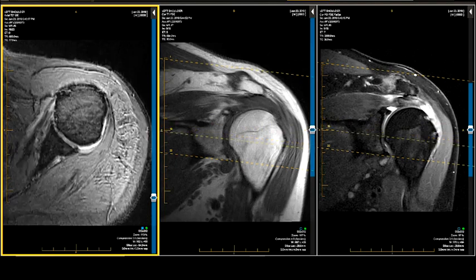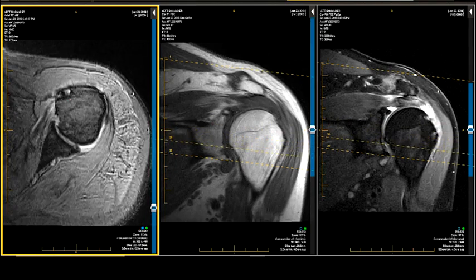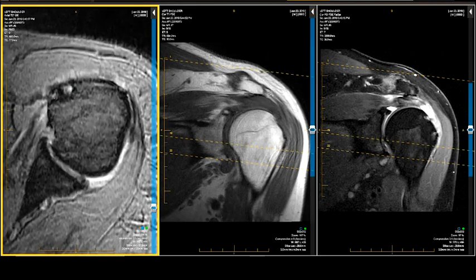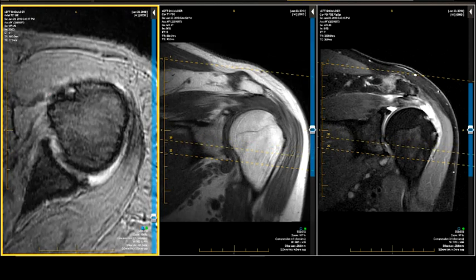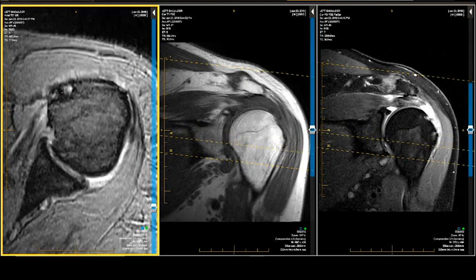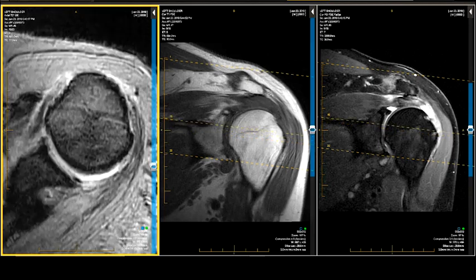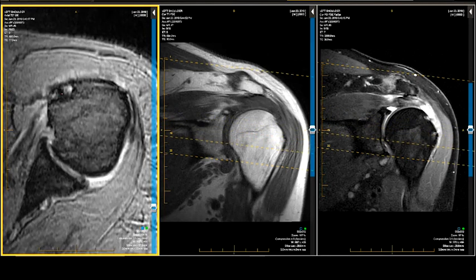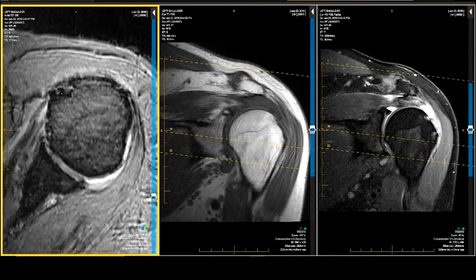Anteriorly, we've got delamination of the subscapularis again. This time we have a very sick-looking, irregular, remodeled bicipital groove. There's the transverse ligament. There's a break in the transverse ligament. So another pulley problem, very common. So delamination of the subscap. Biceps is present. Hasn't really come out yet, but it will. It'll eventually sublux. So I like to see the biceps come out after the subscap disappears.